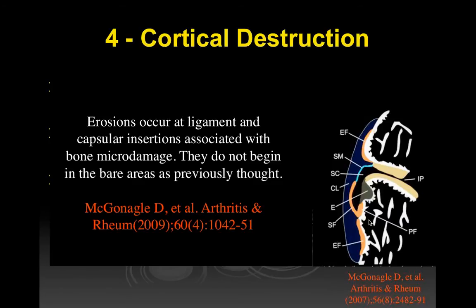And there are a number of studies that suggest that trauma plays a role here as well. You tend to have the most prevalent erosions at capsular insertions that in normal day-to-day function have the highest strains on them. So they tend to be the ulnar side of the second metacarpal head, and right around the second and third metacarpal heads are very common locations. And so it may very well be that micro trauma at the capsular insertion plays a role, which gets back to the fact that maybe it starts in the synovium, maybe the inflammatory cells go through defects that occurred due to traction injuries at the capsular insertion to populate the bone and then start destroying the bone. But anyway, those are all theories right now. Activity of daily living.